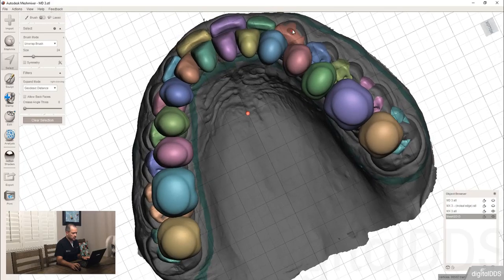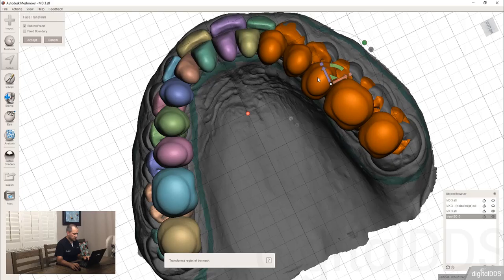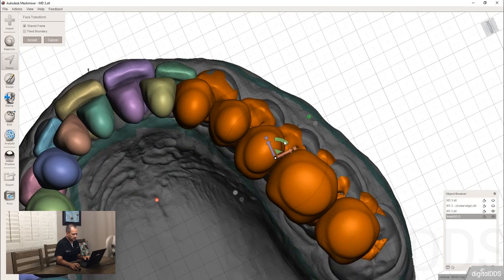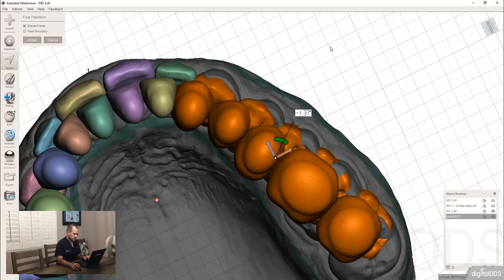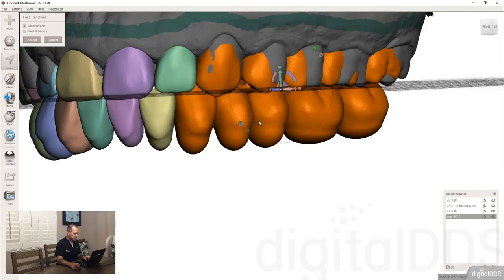But this time it should allow us to do this a lot faster. So we're going to click, click, click. Notice how much faster things are working. So that's the solution if you ever run into a problem where the system is so slow and sluggish. It's because the triangle count is just enormous.